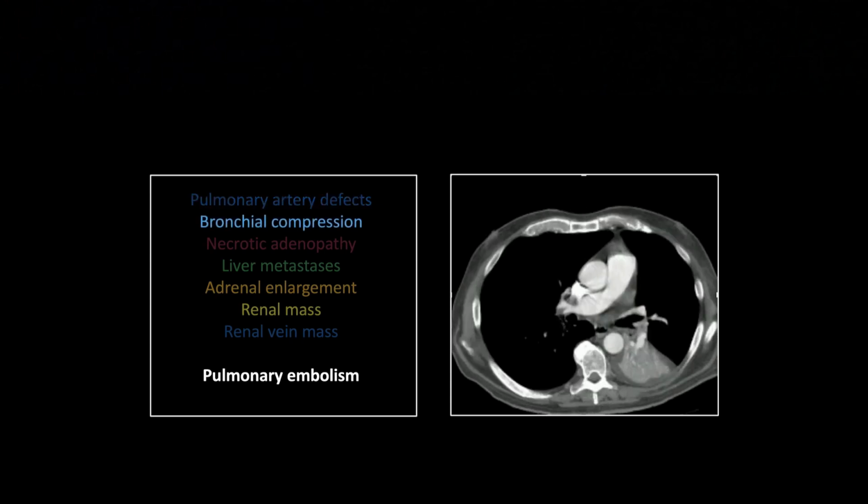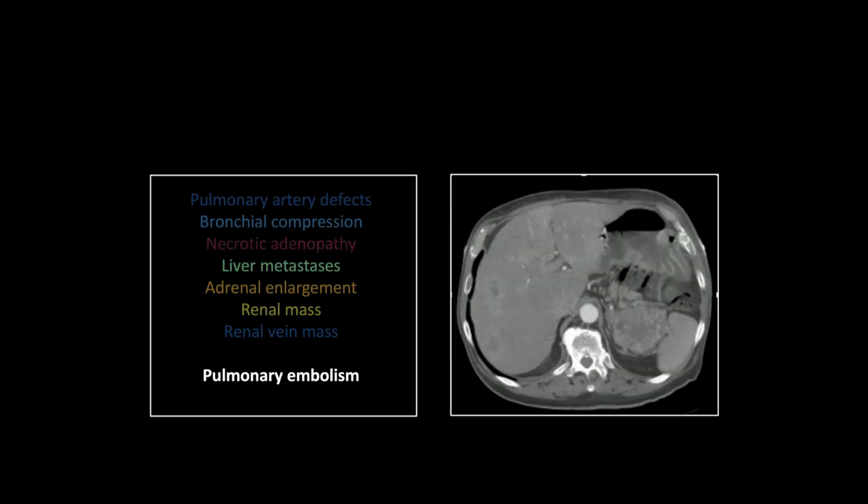But in addition, we've got dense consolidation of the left lower lobe. And the bronchus leading to the left lower lobe, you can see right there, is pinched off. It's compressed, and it's actually due to some adjacent necrotic adenopathy. See, on either side, and there's a little hypodensity in each of those nodes, and they are pressing on the left lower lobe bronchus and causing that airless atelectasis.